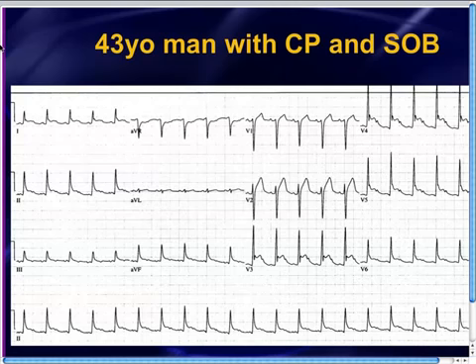There's really not. All of the ST segments seem to be somewhat concave upwards. The way I think of it is if you put a drop of water right in there, would it immediately spill out or would it kind of sit there? And I think in most of these leads it would kind of sit there. Pretty much everything you're looking at is fairly concave upwards.